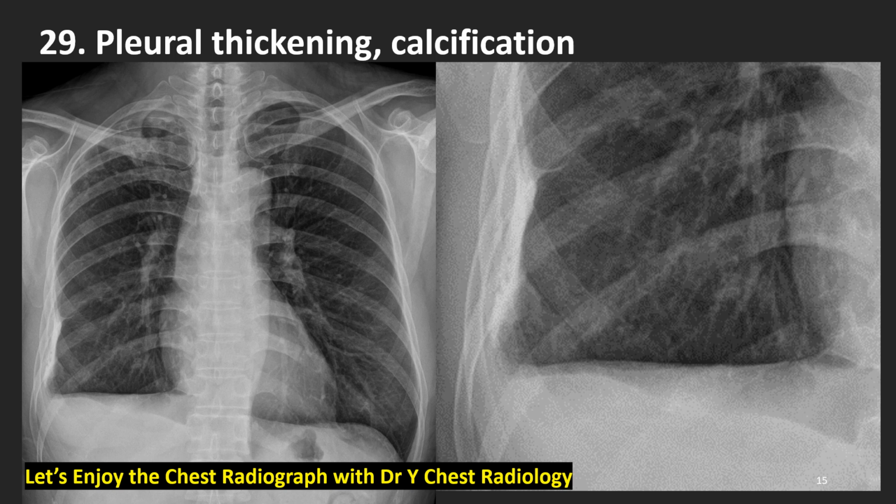How about this middle-aged woman? Her left side is looking good. Normal diaphragm, normal peripheral lung, normal pulmonary artery, normal left bronchus, left main bronchus, left lower bronchus. So her left side is gold standard for comparison of right side. What's the difference?